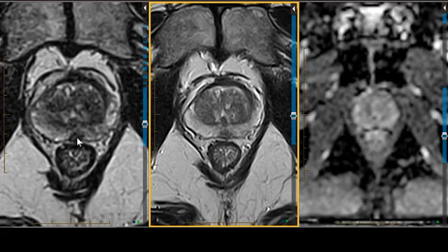So this is an example of 3 Tesla up against 1.5 Tesla. In this example, the 1.5 Tesla wins for the 3 reasons we mentioned. No inflation, very convenient for the patient, don't have to put anything in the rectum. No compression of the prostate gland. Motion artifacts are less. Susceptibility artifacts are less.